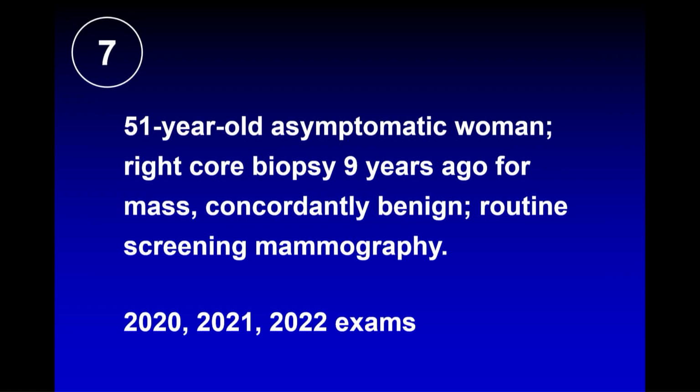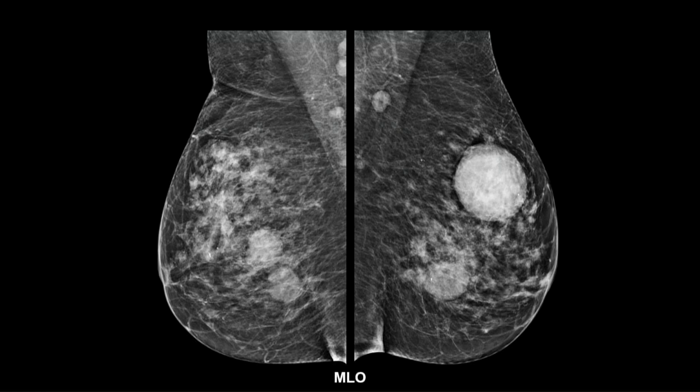Okay, so what do we see here? Oh, we see all sorts of things. This is going to be a confusing case, isn't it? Mike has a finger there. I saw that, Mike. He's seen something else.